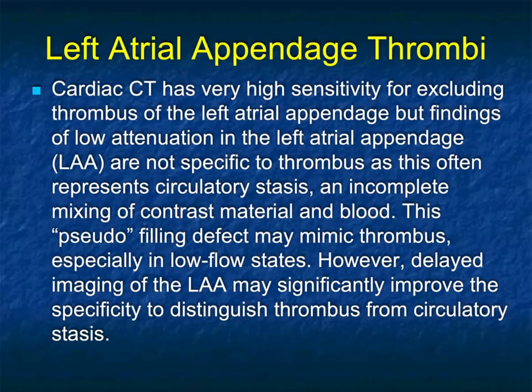And one of the things about thrombi with the left atrial appendage, it can then embolize, give renal infarcts, give splenic infarcts, occlude vessels. One of the challenges, of course, with atrial appendage thrombi, at times you're not certain because there's a defect and a fluid level, and you can get pseudothrombi as well. So that can become very important.